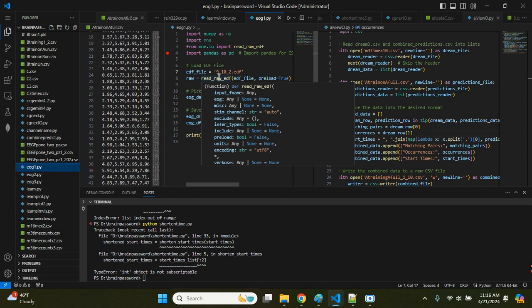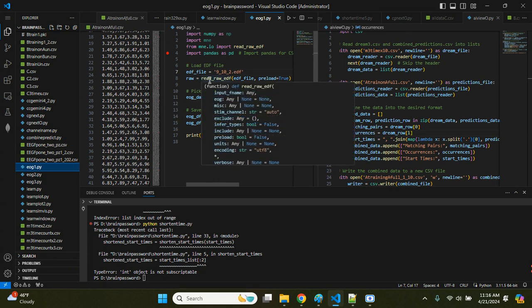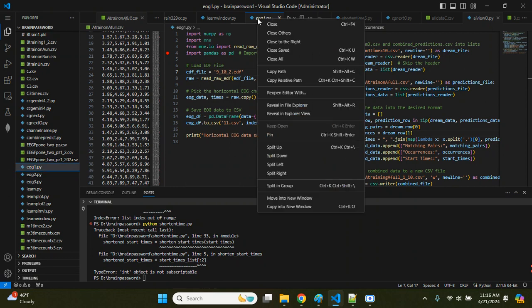We are using the first 10 seconds of that doctor, specifically doctor number 9, task number 10. I think he was cutting a hole in a paper using the Da Vinci guidance of the robotic arm. Okay, let's get right into it.